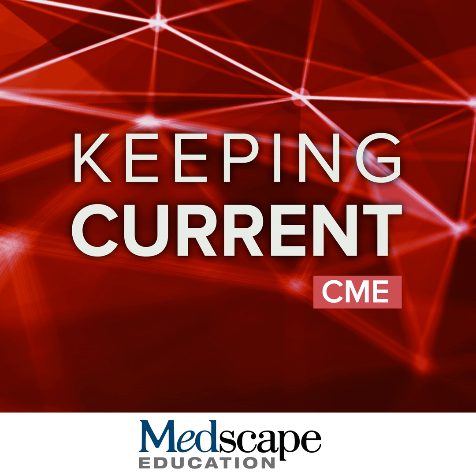So this is an example of a patient with a transmural infarct in the lateral wall with an associated wall motion abnormality also affecting that area. And it's very important, to illustrate, that we look at the cine imaging and the late gadolinium enhanced imaging side by side, so we get a good correlation between the function and the amount of scar within the heart.